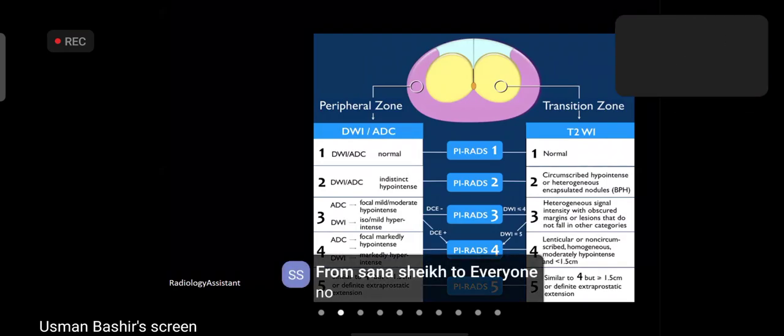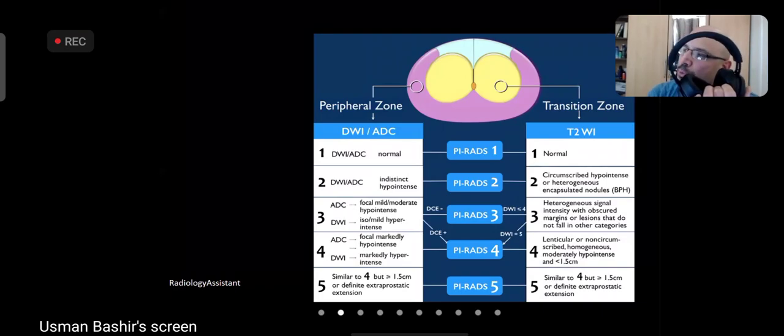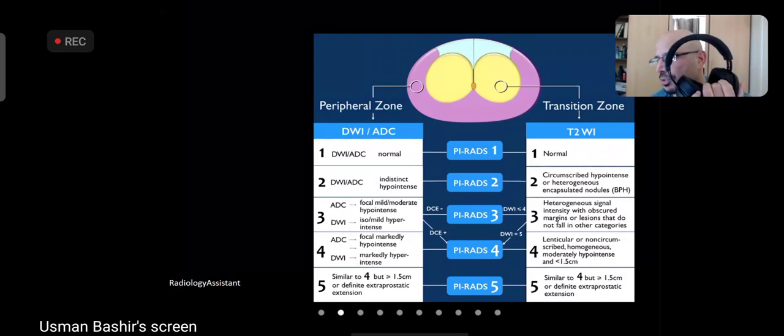कुछ साल से PIRADS 2 आया हुआ है और मैं बहुत बड़ा proponent हूँ PIRADS version 2 का. Main difference ये है कि पुराना जो PIRADS था उसमें T2 weighted imaging was the central point. अगर पाकिस्तान में अभी भी diffusion weighted MRI body DWI इतना popular नहीं हुआ तो I guess it's okay to use PIRADS version 1. जब मैं शौका खाना में ट्रेनिंग खत्म कर रहा था तो हम प्रोस्टेट में हमने शुरू कर दिया था डिफ्यूजन करना. बाकी we were still trying to develop things. So by now I hope it's widely available, widely done.